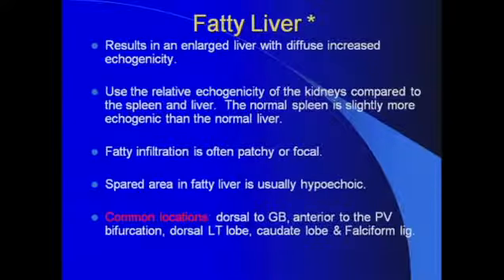Fatty infiltration is often patchy or focal. Now, a spared area in a fatty liver is usually hypoechoic. Remember that whenever you see a focal hypoechoic area on a background of a fatty liver, don't ever jump and say, well, there is a mass in the liver, we need to investigate further.